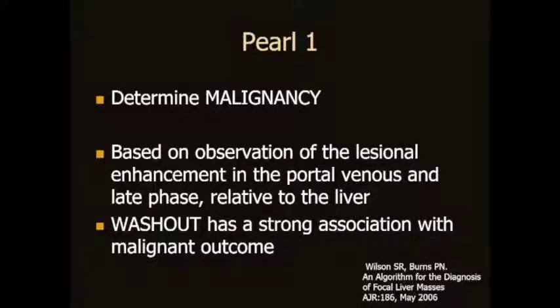Well, first of all, we want to determine malignancy. And so this is largely based on the observation of the lesional enhancement in the portal venous and late phase relative to the liver, with the recognition that washout has a strong association with malignant outcome.